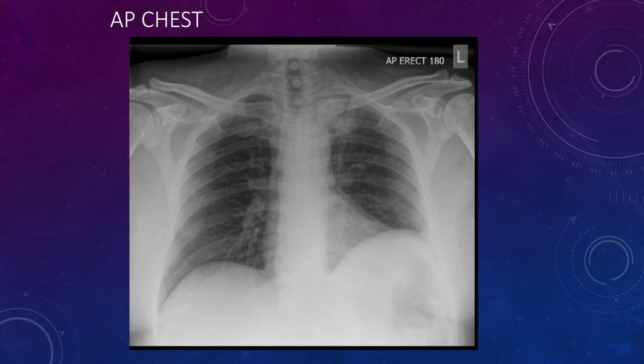Well, we're happy that's a normal AP chest x-ray. Or it's just after lunch and my brain's still not started working yet, because all my blood is going round my belly trying to process the food I've just eaten. The latter, maybe the latter.